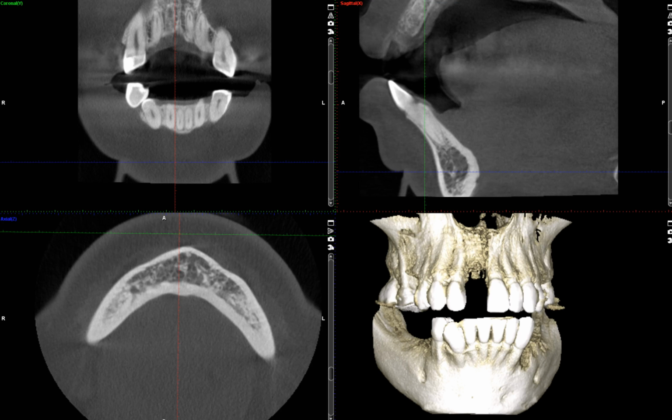In today's video, I'm going to show you what I call super incisive nerve. Of course, that's not an anatomically correct terminology, but based on our anatomic understanding, the incisive nerve courses anteriorly to anastomose with the lingual nerve within the lingual canal. That's what I have learned and read about in the textbook, but I have almost never seen that occurring in cone-beam CT.